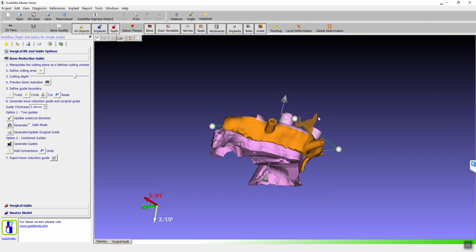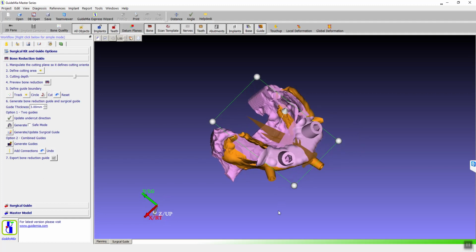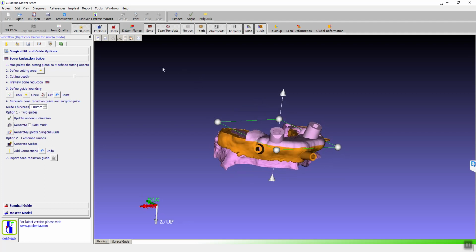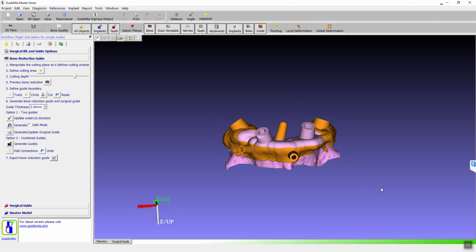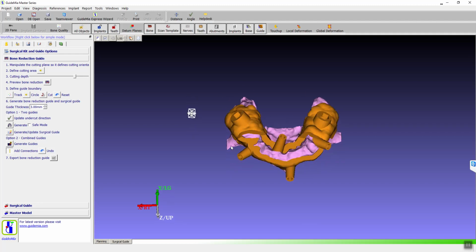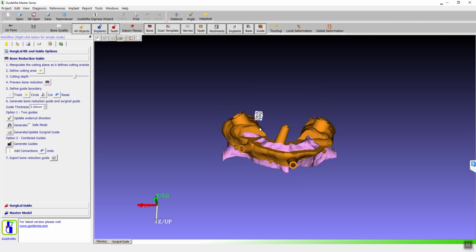This is a display artifact. Forget about this. So let's say we have the two guides already. What we want to do is add a connection between the two guides. So the next step here is to do that job. So I'm going to create a slot on this one.